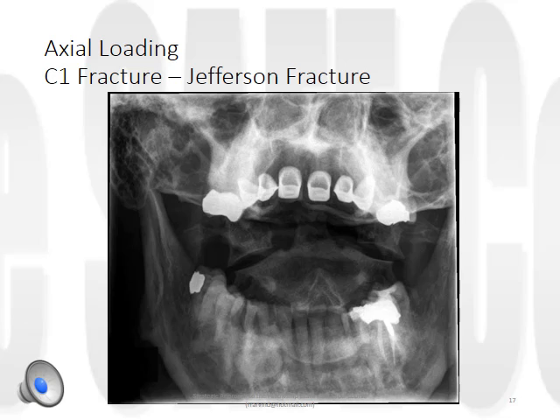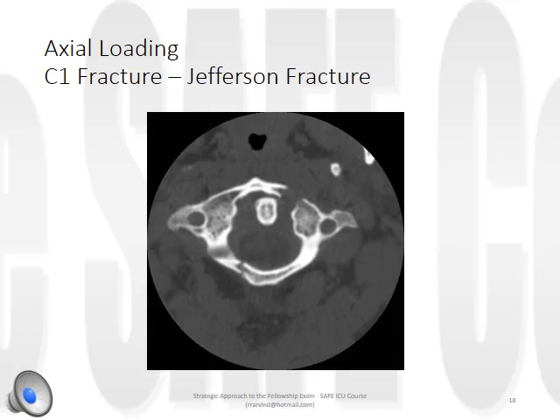It consists of a fracture of the anterior and posterior arches of the C1 vertebra, and damage to the arteries of the neck can result in lateral medullary syndrome, Horner syndrome and ataxia, and loss of the ability to sense pain or temperature. On the axial CT image, you can get a clearer understanding here of the fractures of the anterior and posterior ring of C1.